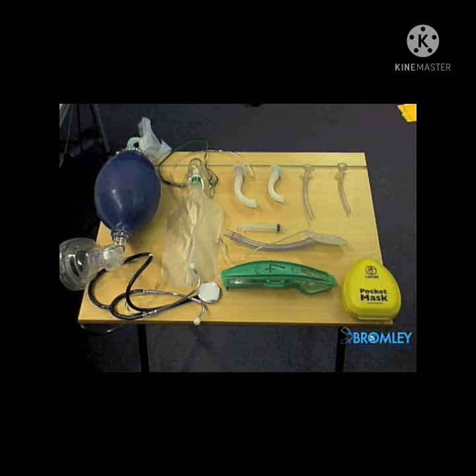It is essential to remember that when faced with a table full of multiple pieces of airway equipment, not to feel pressurized to have to talk through all this equipment. It is often far more appropriate to ascertain a student's level of knowledge and then to pick an appropriate topic from there.